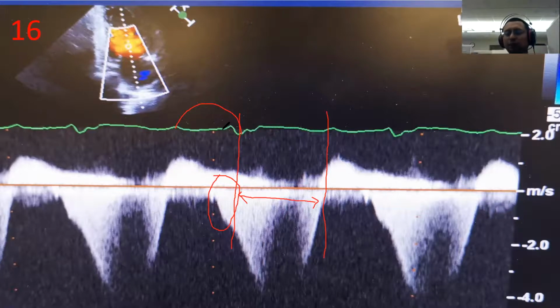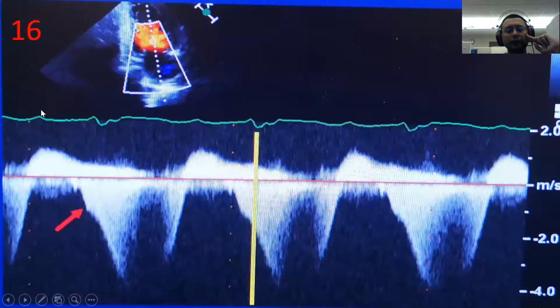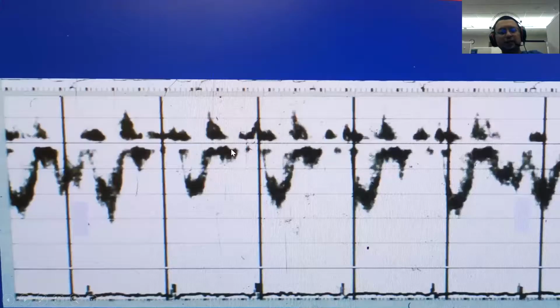I don't know what the reason is. So maybe that can be a homework for both of you. And then the next time we discuss, you can tell me why a patient with first degree heart block can get diastolic MR. Or maybe we can discuss together what other causes of diastolic mitral regurgitation there are. Okay, so this is a patient with diastolic MR secondary to first degree heart block. That's the diastolic MR there. So it happens at diastole. All right.